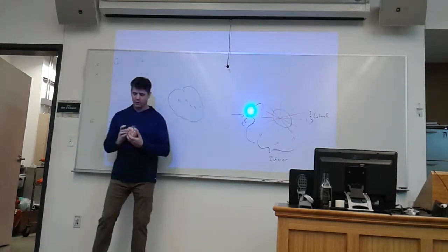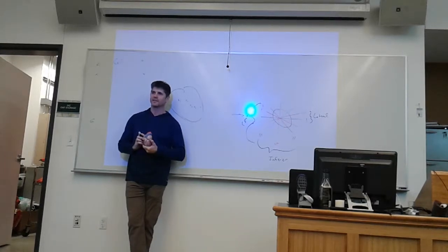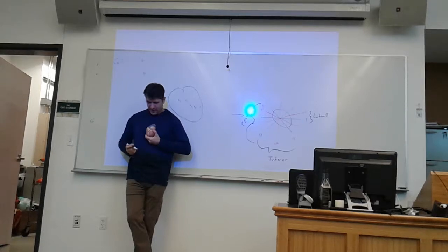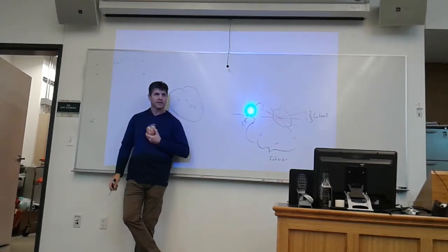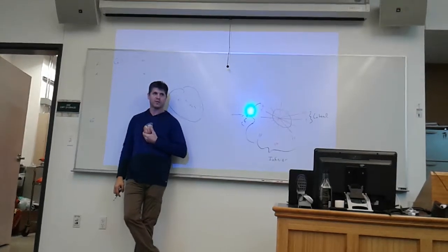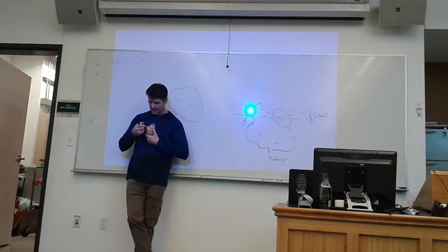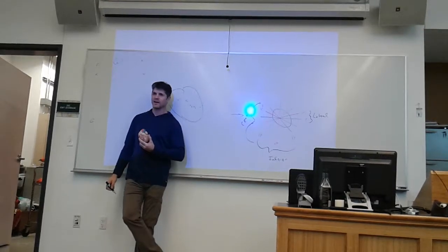V1 looks at what? Septum. More specifically, what's it look at? The front, right atria, the right side, because remember, these coronary vessels, the left anterior descending coronary vessels, travel the septum, yes? Between the right and left. But we're not splitting the septum, because why? Because the heart is shifted.